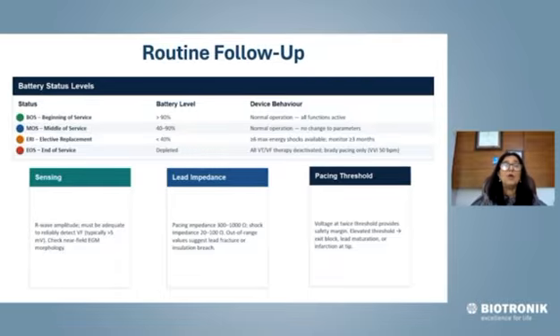And one word of caution: whenever you check any CIED, make sure that when it is being interrogated, you have the ECG also on your programmer. This is a very important thing. It will allow you to match the far field EGM with the ECG. It will allow you to see the threshold so much better. So always connect the ECG. Sensing, it's important to check for the sensing, the R wave.